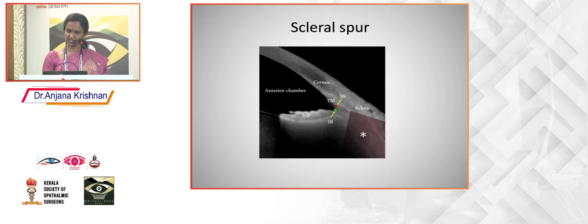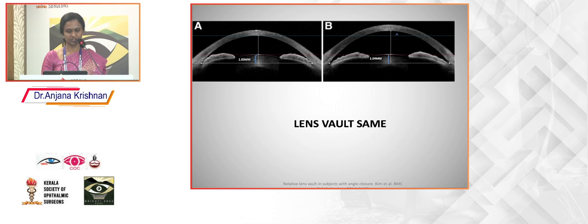Regarding the scleral spur, Dr. Sandhya has given the details about how to identify it. It is the prominent inward extension of the sclera with a change in curvature. It is used as a reference point to identify the trabecular meshwork and iris root.